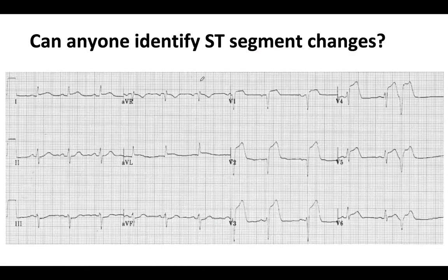Okay, so can anyone identify ST segment changes here? ST elevation in chest leads, okay, ST elevation in V1 to V6, okay.